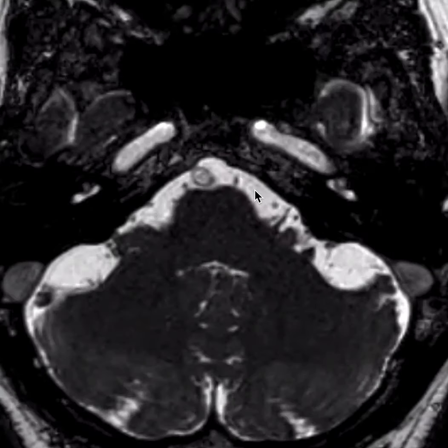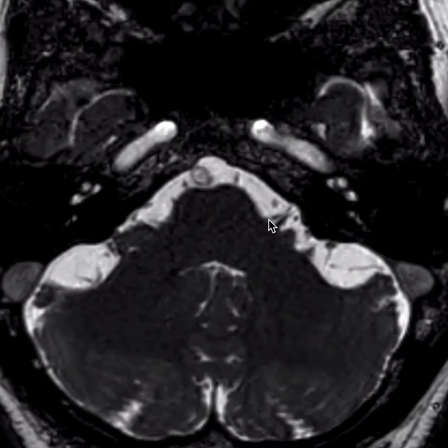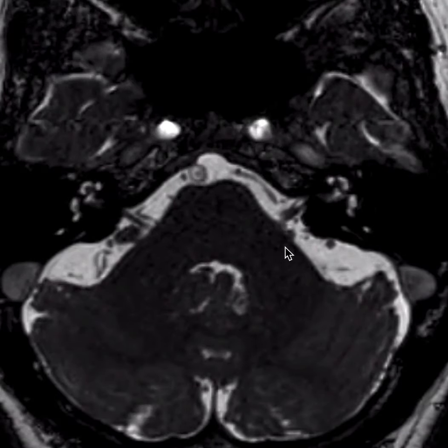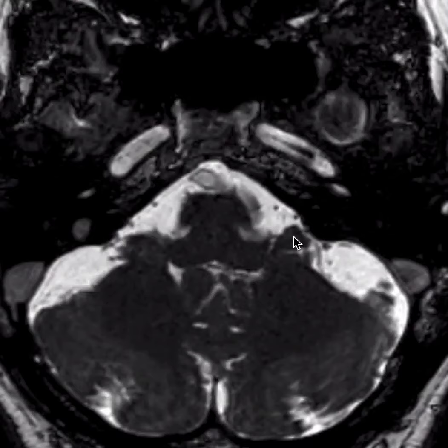As I continue down, I'm now at the level of the cerebellopontine angle cisterns. It is off the inferior aspect of the pons here that cranial nerve 7 and 8 will arise. They are nearly parallel in their course through their cisternal segments as they cross the cerebellopontine angle cisterns, and they stay nearly parallel to one another as they course through the porus acousticus here and enter the internal auditory canals here and here. As I scroll a little more inferiorly, I'm going to notice an important lobe of the cerebellum. This right here represents the floccular lobe. It separates cranial nerves 9 through 12 below from the other cranial nerves which we've discussed.